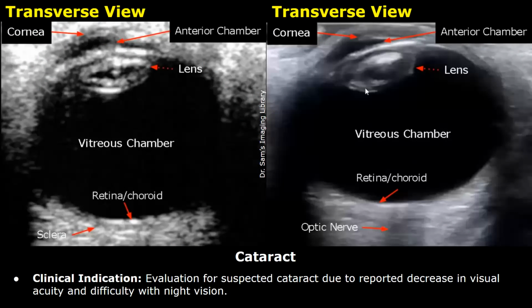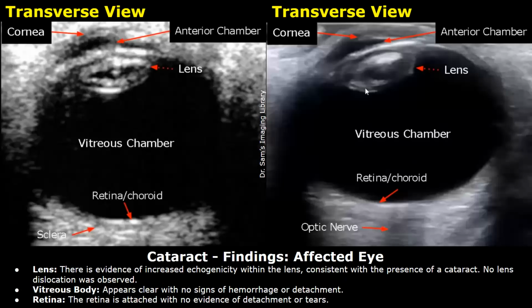This is a report for cataract. The clinical indication in this case was evaluation for suspected cataract due to reported decrease in visual acuity and difficulty with night vision. These are the findings related to the affected eye.